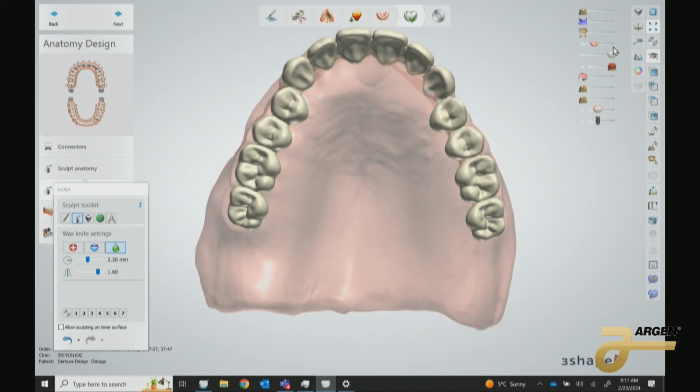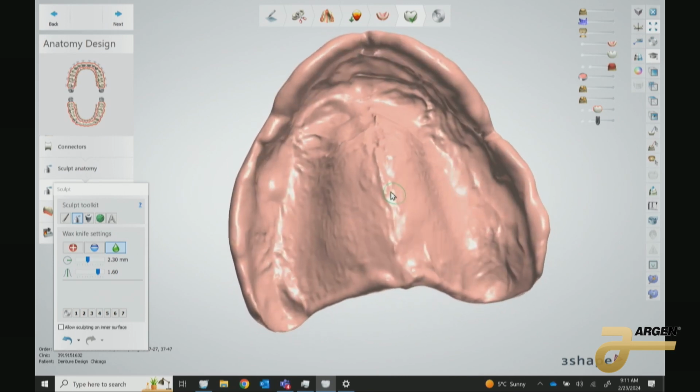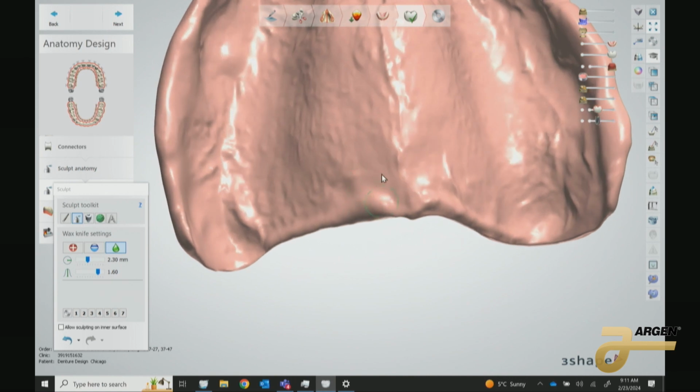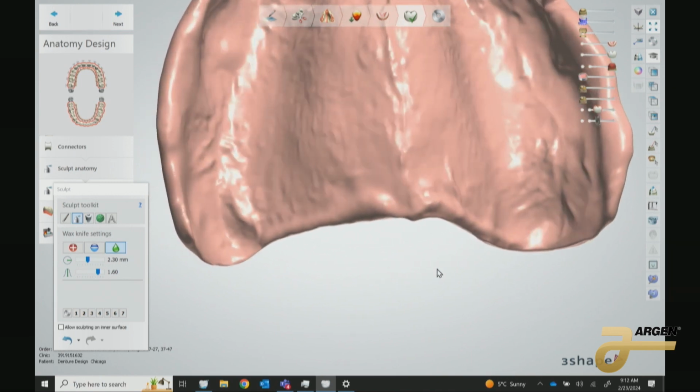And if we look at the underside, this is where we can do our post-dam. So you can see the difference here a little bit. I'll zoom in there. This side I've cleaned up. I blended this down a little bit more. I made sure that there's no weird triangles or lumps, because when you're carving it in the software, it can get a little messy sometimes. So I cleaned it up. As you can see, this side here is a little aggressive, a little lumpy. So that's where I'm doing that.